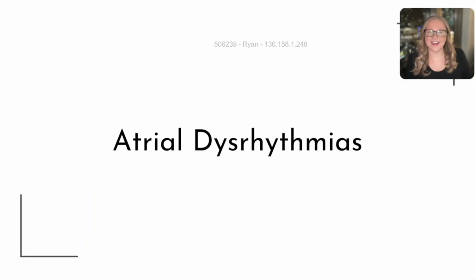All right, now that we've got our heart blocks out of the way, let's move on to talking about some atrial dysrhythmias. This means that something is going on up in the atria, right? So you should expect that there are going to be problems with the P waves, since the P waves are what show us that the atria are contracting. If we have atrial dysrhythmias, we may not have normal P waves.